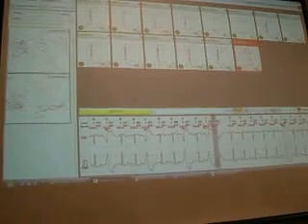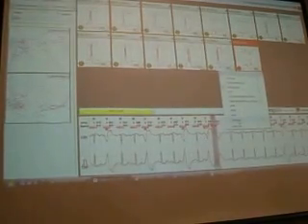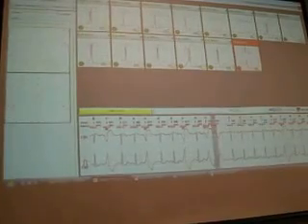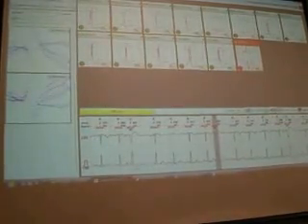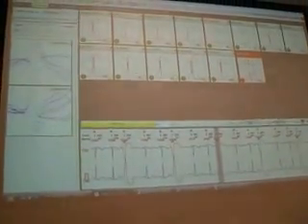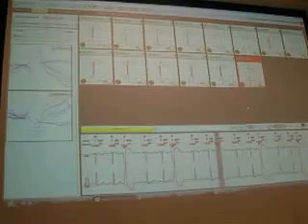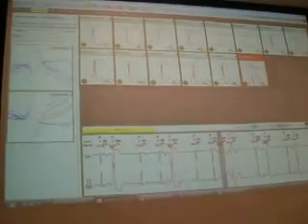And then I rename this cluster noise. Every QRS which was not fixed in this cluster is renamed noise, and the others which were fixed stay in the same cluster.